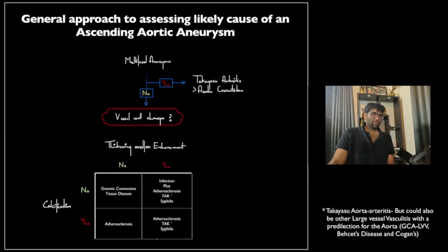In this case, naturally, the Takayasu or other large vessel vasculitis have been there for a long period of time, and syphilis has been there for a long period of time. So, the clinical presentation and how rapidly the patient presented also needs to be considered while considering the validity of these imaging findings. Now, infective aneurysms may also have gas within the aortic wall. This is something that is odd but strongly suggests infection.